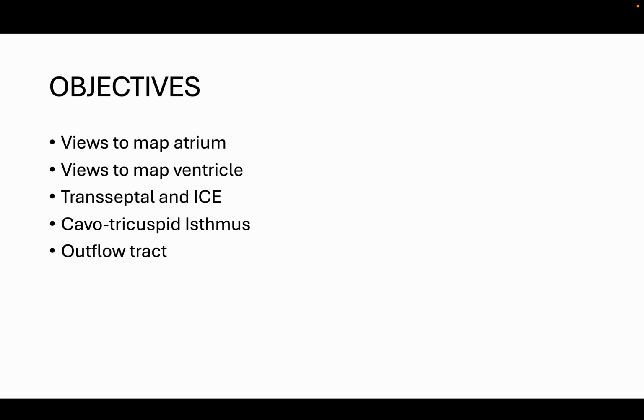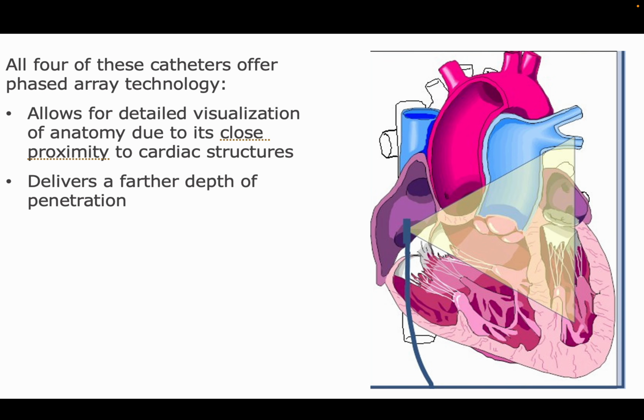The objectives for the talk are to see what views are used to map the atrium and the ventricle, and how the intracardiac echo helps in transeptal punctures, cavo-tricuspid isthmus evaluation, and management of outflow tract pathology.